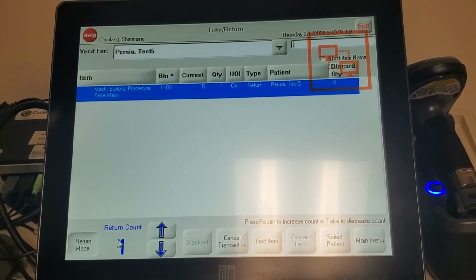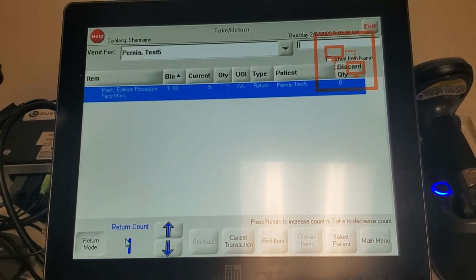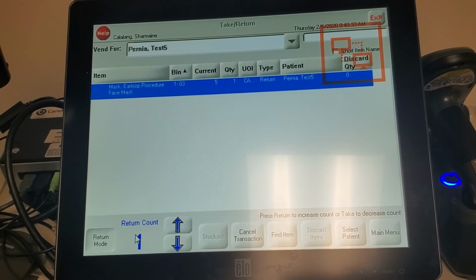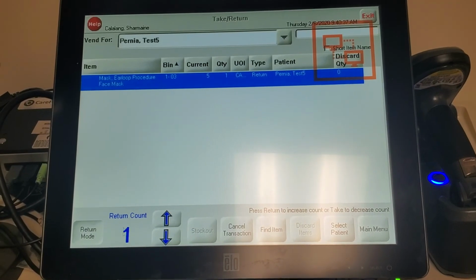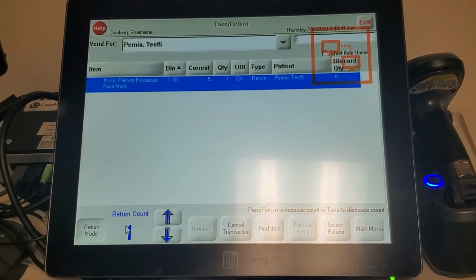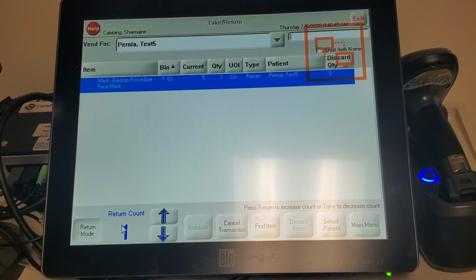Just to add, remember, Brian, you had a question before regarding the routine non-chargeable items. That's where you'll find all the items once you scan them, but only the chargeable item will be reflected on the patient. It will drop to SFM or to the patient claim. And whatever you take out, it will go to inventory, whether chargeable or non-chargeable, since you pulled it out from the supplies.